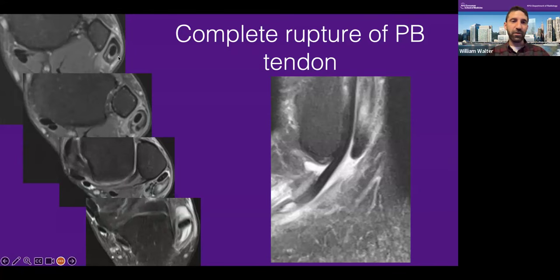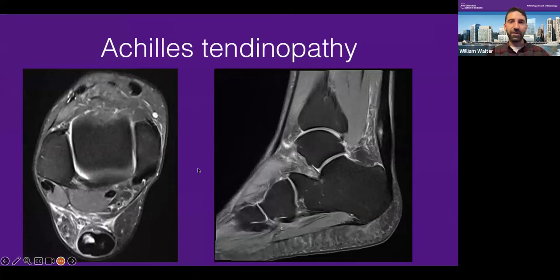It's almost fully encompassing the intact peroneus longus. It kind of swirls around posteriorly here. Here it is very bright and swollen, lots of tendinosis going on, and then suddenly it disappears. So on the sagittal view, you really get the full story. This is peroneus longus intact, and peroneus brevis here with a tear and a proximally retracted stump, and it just suddenly falls away. This is a retracted, complete rupture of that tendon.